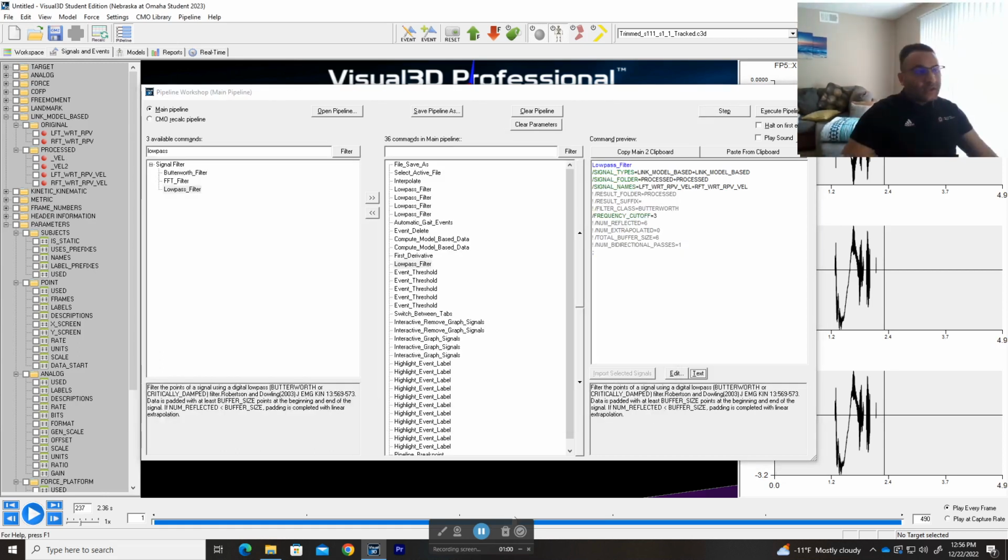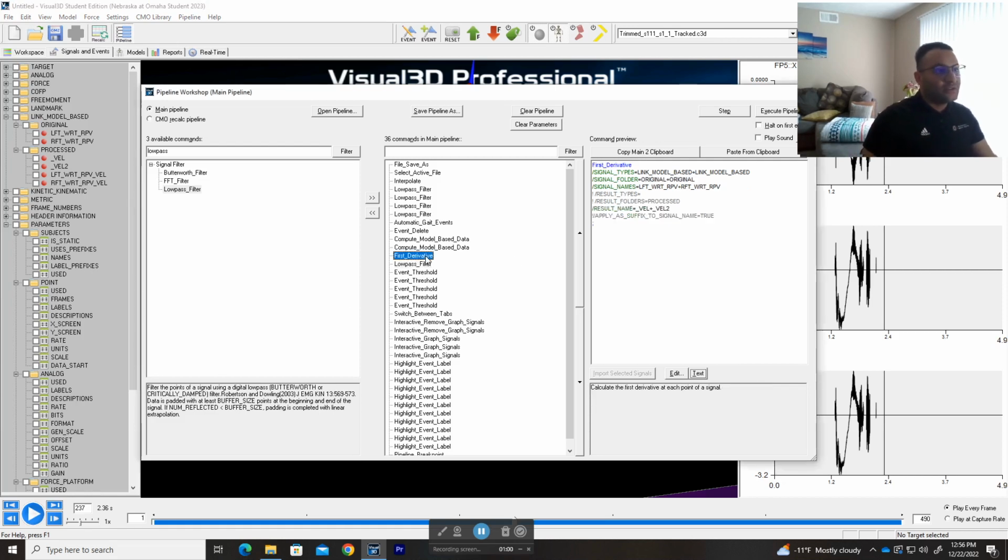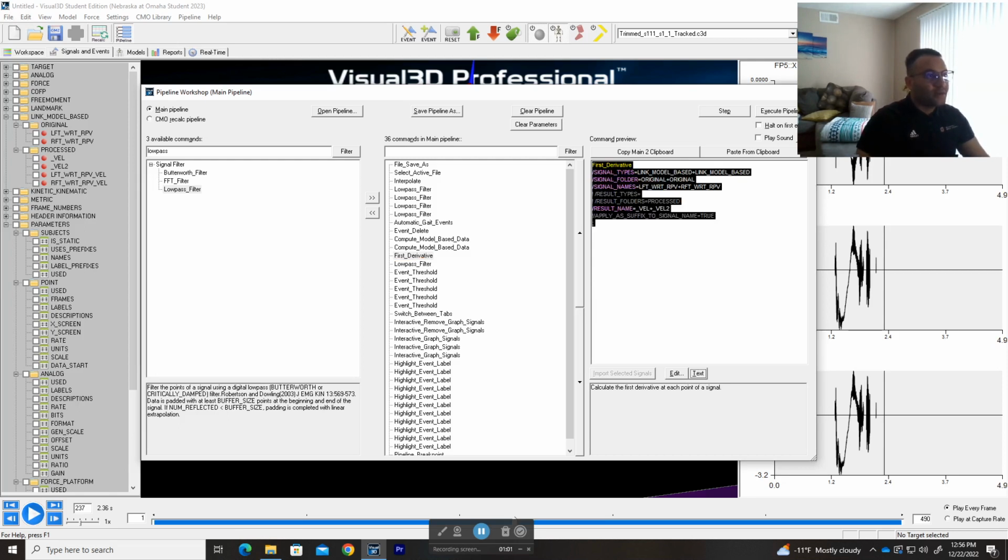So it's not very complicated. You just need to get used to it. It's actually much more user friendly, but also it's very powerful because when we get deeper into how to create your own models and how you can create your own code, you have basically the sky is the limit. You can do anything you want within the commands that are provided here.